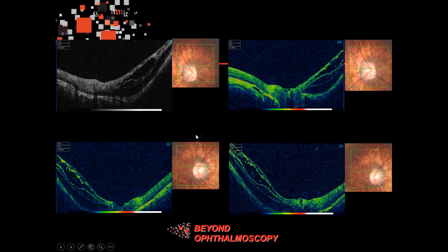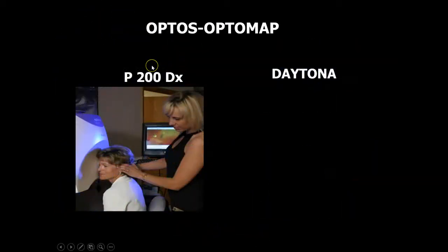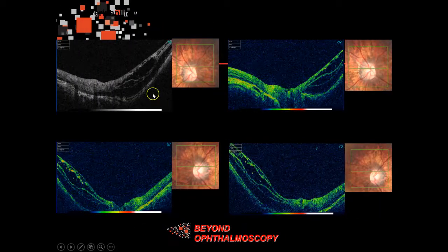In the series that we looked at, we actually looked at myopes over 10 diopters, and a significant number of these patients actually had splits. This is a retinal schisis. Again, multiple splits within the retina. This is a schisis. This over here is a right eye, so the schisis is nasal. It's a horizontal cross-section. This is also a right eye, showing us in grayscale as opposed to color. And down here, we're seeing the same.